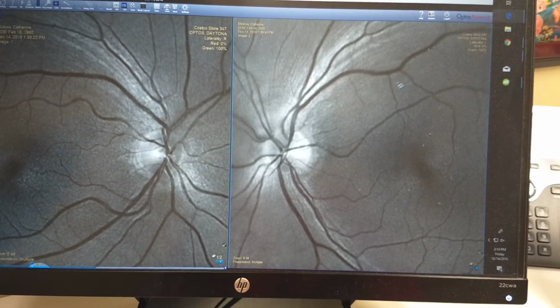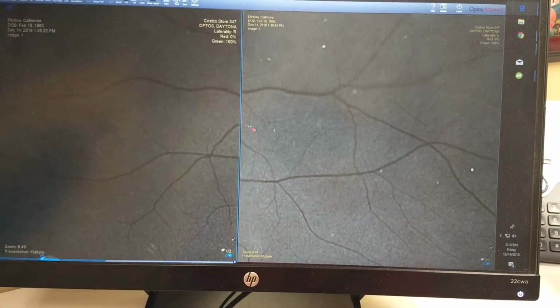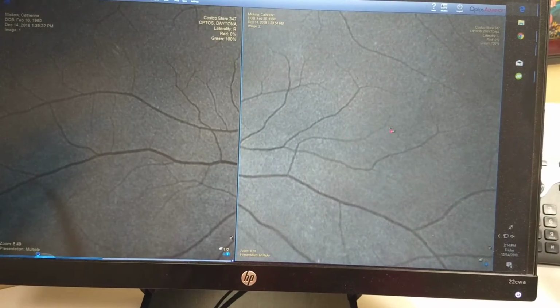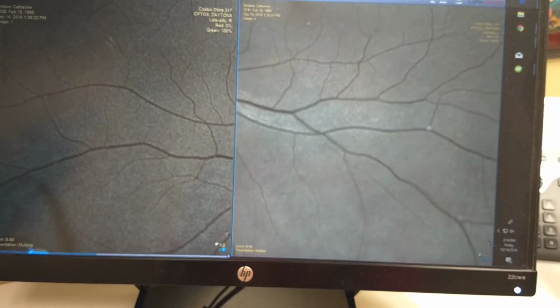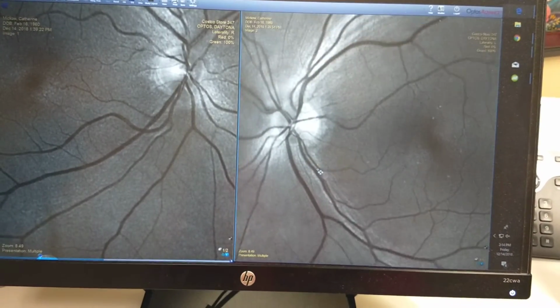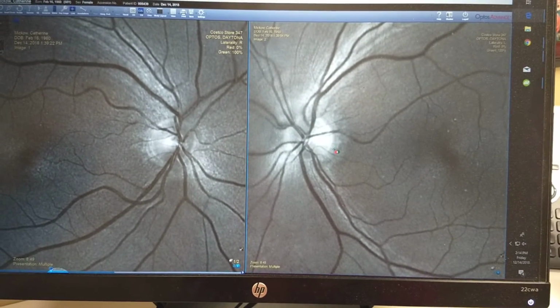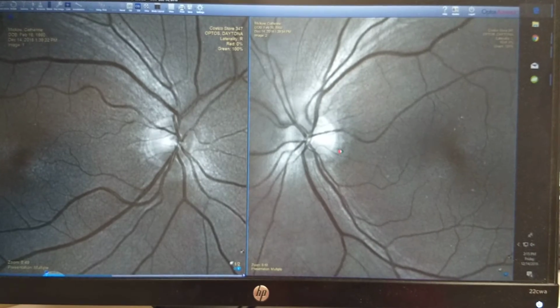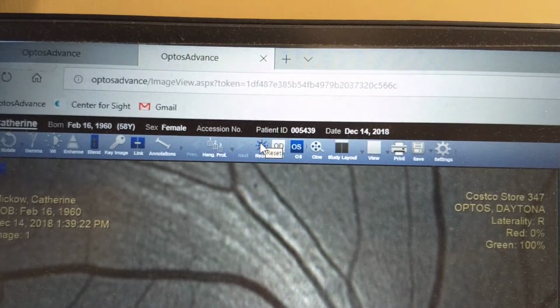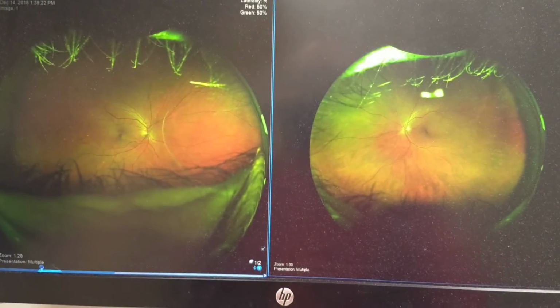Then you right click again to move it around to show everywhere, and so it will follow. It just doesn't go smoothly. After you unclick, it moves the second page, second screen, I guess. Alright, so then you're back to here. It's hard to get it to go back to normal. The way they always say to go back to normal is to come back up to here and just click the reset button. When you reset it, it goes back to the way it was to begin with.